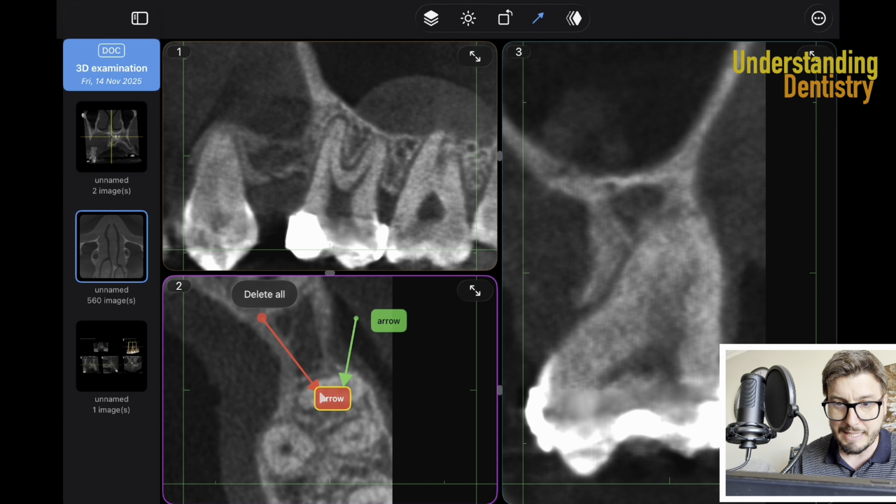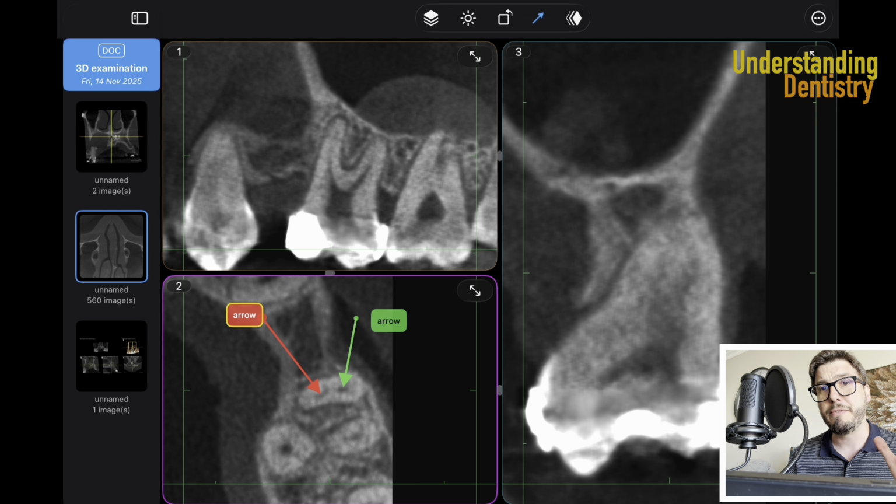And this is the MB2, which is so much more narrow, and that's also very common. It's narrow, sometimes it's difficult to find. We find it in half of the cases, that's the statistics among dentists, so that's why it's very important for you to navigate properly through CBCT slices. So you already found it in the axial plane. All right, the next step is very simple.